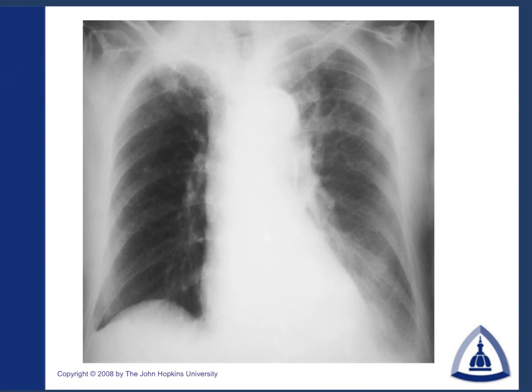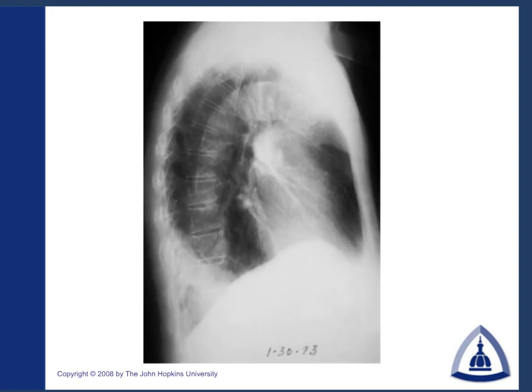This is a patient with shortness of breath. This X-ray shows a haziness on the left side here. We lose the left hemidiaphragm. Comparing the lower lobes together, much hazier on this side. And when we look at the lateral, we see this nice meniscus here, and this is a left-sided pleural effusion, small, in a patient with a splenic infarct. Okay, so just one of those things to remember when we see a left-sided effusion.